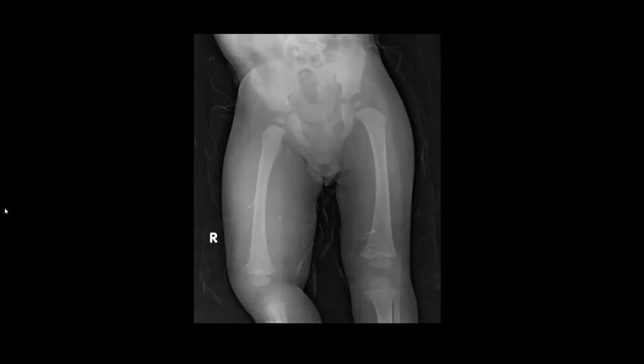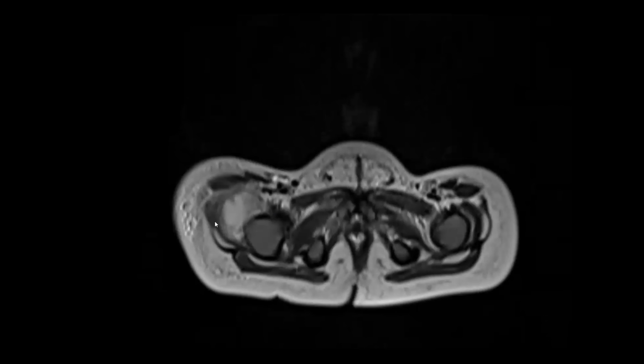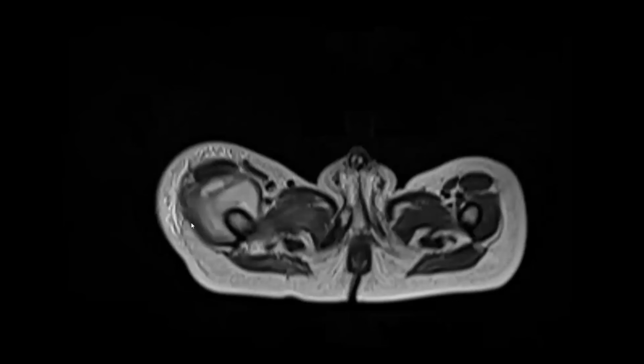And then you have to comment on the cortices, that these are fine, and also again try to practice on the sequences of MRI, which sequence is this, and you have to identify quickly. You did well on that, and then again it was a large abscess with osteomyelitis, and that was all from my side.